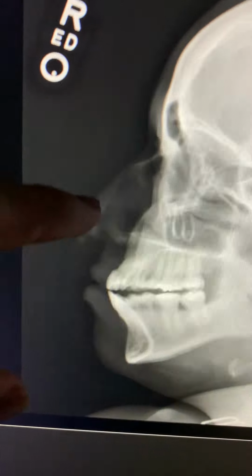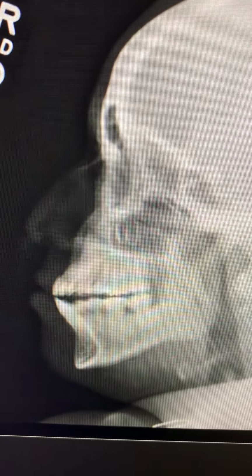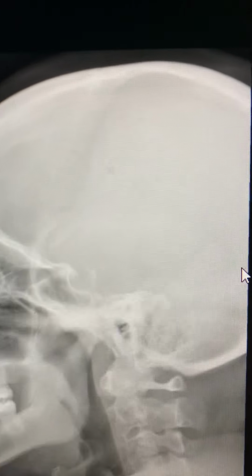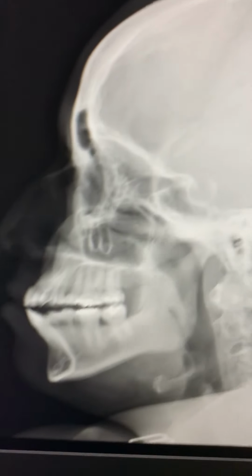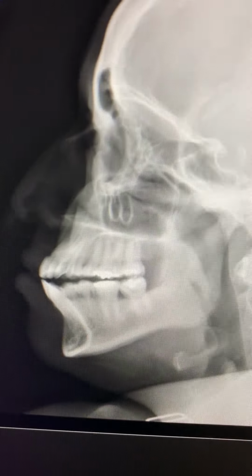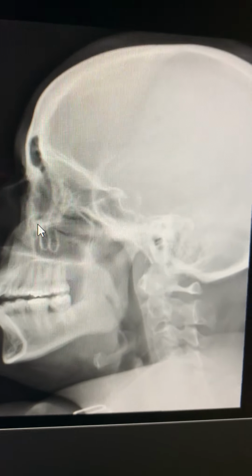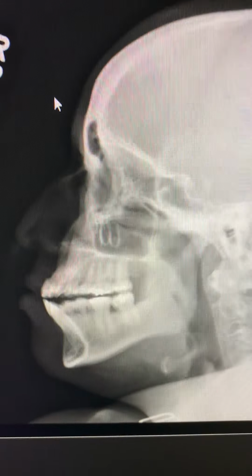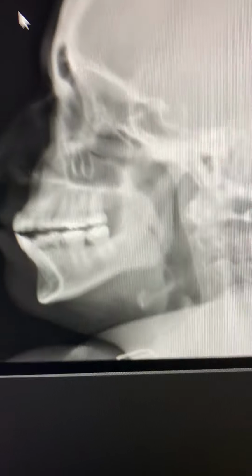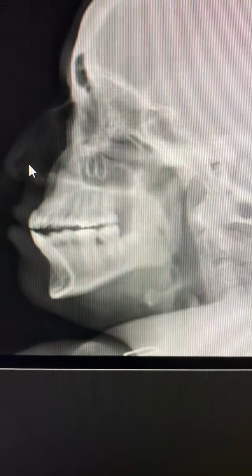tissue structures, which would also demonstrate that we had great contrast. We have good contrast, as we can differentiate between sharp bony margins, demonstrating that there's no motion, to the soft tissue structures. So we have good contrast and decent density that we were able to tell everything apart. This is marked lateral in our light field, just to make sure. The patient was upright. They were just seated down, but everything is upright with a horizontal beam.